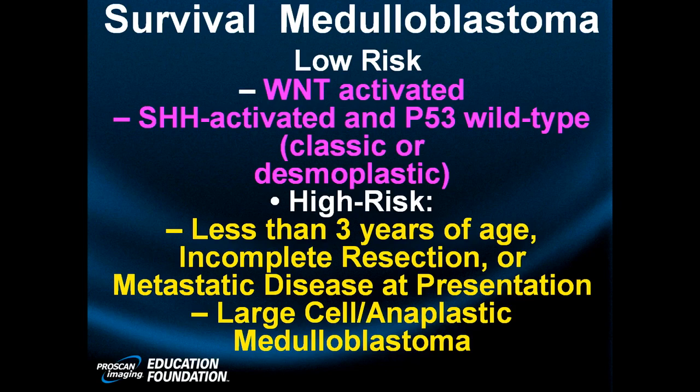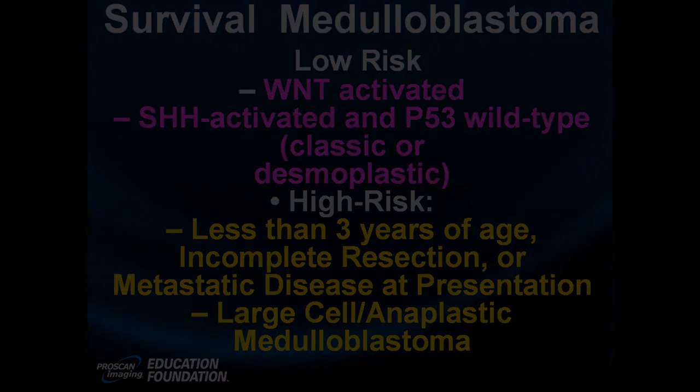We'll stop right there. That's a lot of information on medullo, a heavily packed, heavily cellular, very scant cytoplasmic tumor with intermediate signal intensity, sometimes simulates meningioma, near the surface in the adult, closer to the midline, likes the superior medullary velum, has a cleft between it and the brainstem, allowing differentiation from ependymoma, which tends to bleed more frequently, go out to the sides more frequently, and is seen in a slightly older age group in children, and certainly in an older age group in adults.